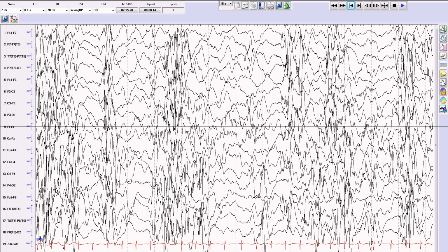Here's our next EEG example, and it is an important one. This is another pre-treatment patient presenting with infantile spasms. For infantile spasms patients, it is very common, especially during sleep, for multifocal spikes to take on a grouping pattern. In fact, bursts of grouped spikes are often followed by sleep spindles. This phenomenon is particularly important to consider for this study, given that all epochs are taken from sleep. It is critical to the validity of our scale for this grouping pattern to be interpreted as grouped multifocal spikes as opposed to generalized epileptiform discharges.